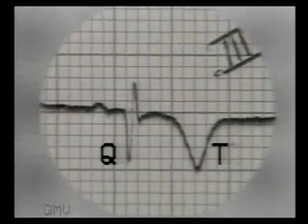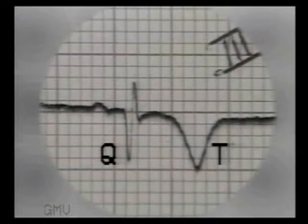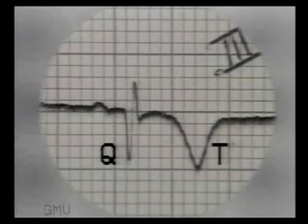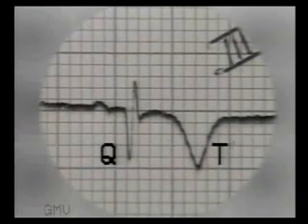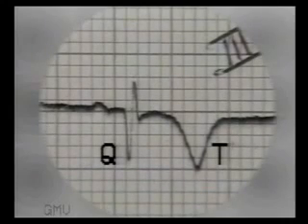Lead 3 of this ECG shows deep Q wave, isoelectric ST segment and deeply inverted symmetrical arrowhead-like T wave of inferior wall myocardial infarction. This picture is seen between 3 weeks to 3 months. If ST segment elevation persists after 6 months, it suggests a development of ventricular aneurysm.